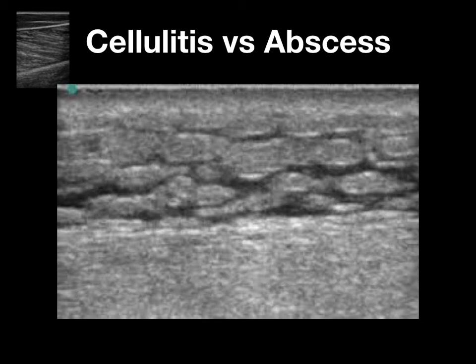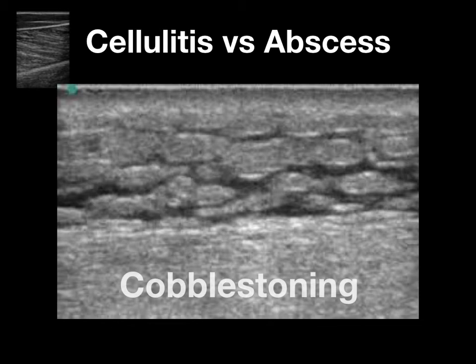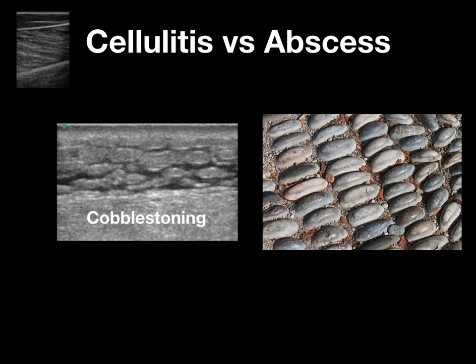This finding is indicative of inflammation and is synonymous with cellulitis. While non-infectious edema will appear similar, differentiating between these two entities can be made on physical exam as well as the brightness of the soft tissue islands. In acute infection, the soft tissue islands will appear brighter, while with edema, the islands will appear more dull.